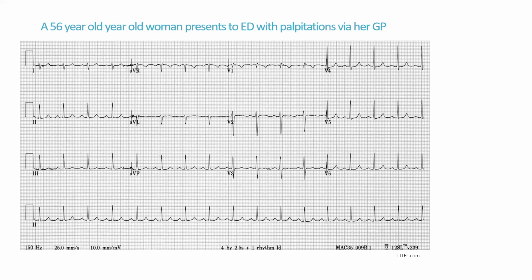Oh, yeah, somebody's put flutter. I can see where you're coming from. You could definitely be forgiven for that. Yeah, somebody's put sinus rhythm. You're right. Now, I know why somebody's put flutter. It still is going a bit fast here, isn't it? It is actually just under 100 beats per minute, but it's definitely come down from what it was.